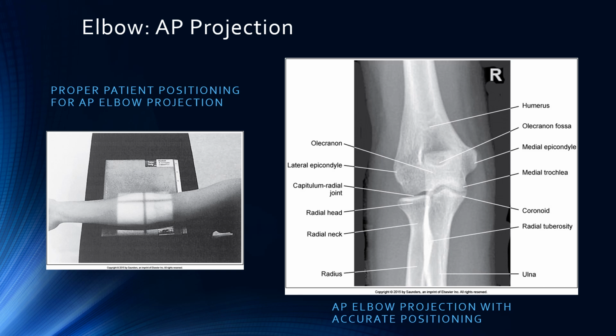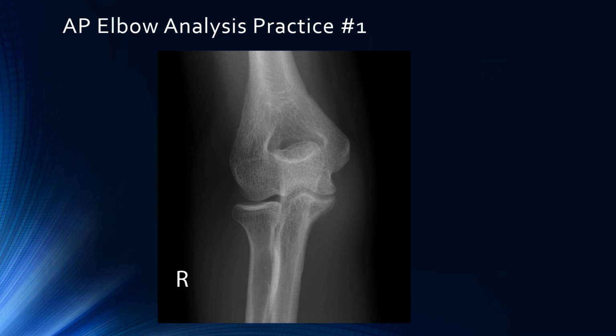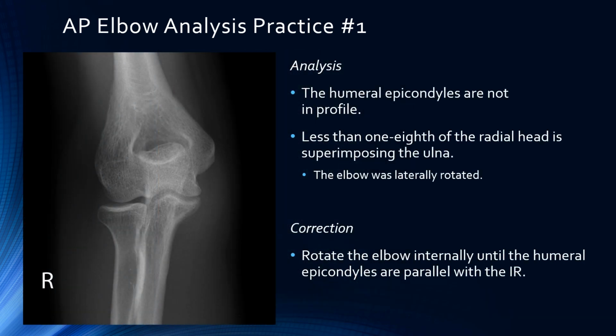AP elbow projection. These are two good examples of an AP elbow. You want to center mid elbow. AP elbow analysis practice number 1.